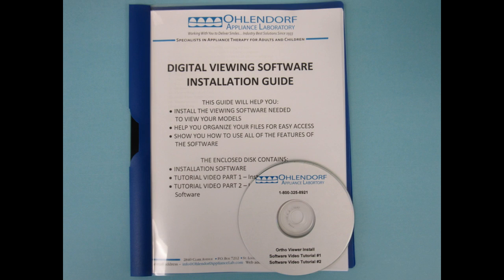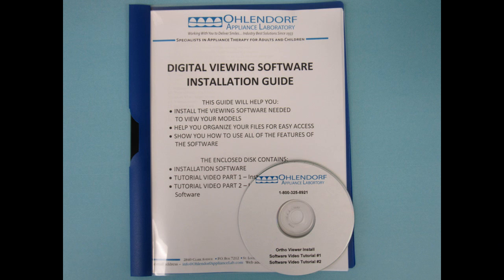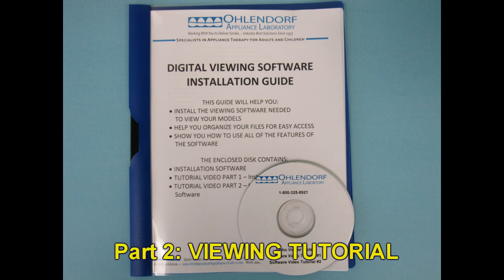When you receive your first set of digital study models from us, you will receive a disk and a user's manual. The disk will contain the viewing software to download and 2 videos. The first video will be the one that you're currently watching on how to download the software and set up your patient folders. The second video is a tutorial on how to view the models in the software and the many benefits and features the new version has to offer.